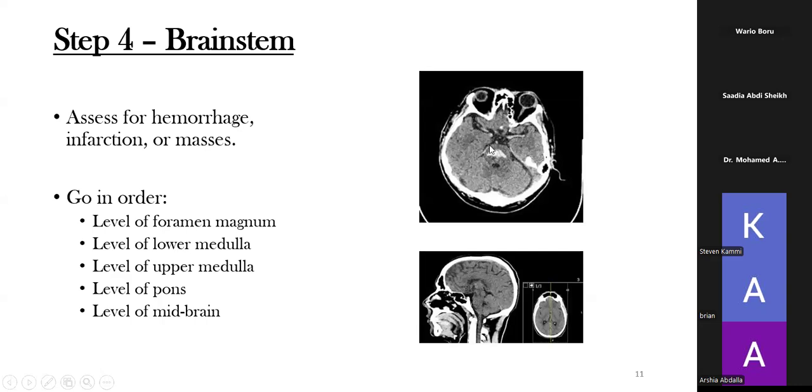So when you start seeing a swelling like that, then you know that this is a patient, for example, that has a hyperdensity in the pons. Think of it like a pregnant woman who's standing. The head is the midbrain, the abdomen or the belly is going to be the pons, then the legs would come down to the spinal cord, and these are part of her thighs.